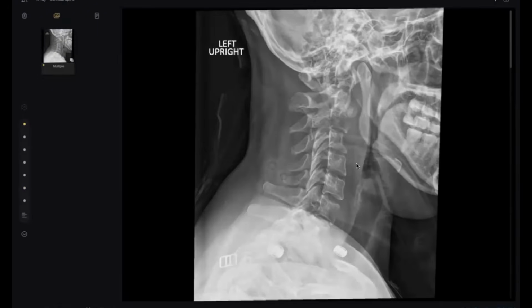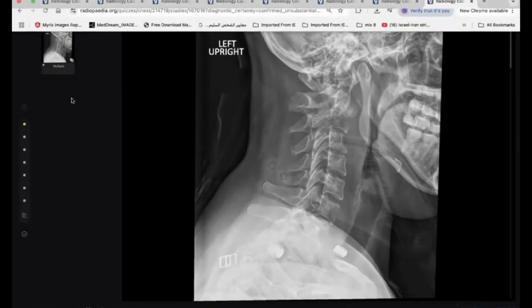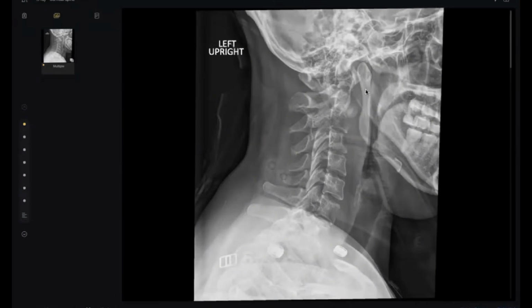Take some home messages. This cervical X-ray is very critical. Number one, you did very well when you talked about the erosion here, and I think at C2, 3, 4, 5, 6, 7. But the most important and very clear finding is the prevertebral thickening. There is very obvious prevertebral thickening here in front of C2. It should not exceed 6 mm, but I think this is about 20 mm. So there is a very large prevertebral thickening or collection, and you excluded the presence of any gas.